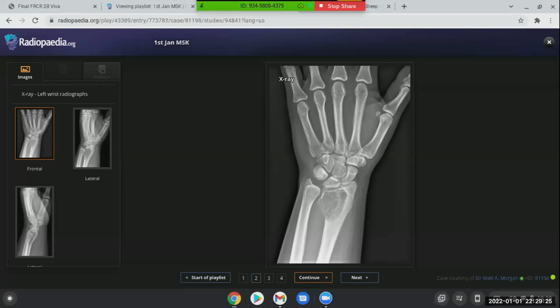My question is, can we have giant cell tumor and then some component of ABC in it? Yeah, actually, the ABC could be a primary one and could be a secondary one on top of the giant cell tumor. This is the same spectrum of the disease. Pathologically, we can have some kind of overlap between both diagnoses. Okay. Is there any other differential that comes to your mind when you see an epiphyseal lesion?